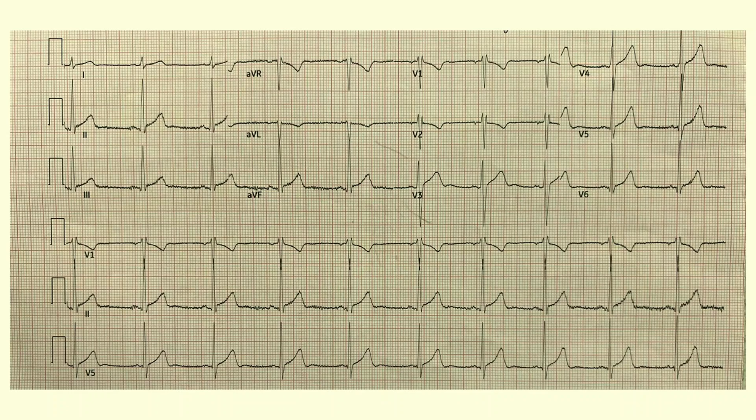But even more importantly, I know for a fact that these electrodes are misplaced because the V1 and V2 P waves are completely upside down. Remember, V1 and V2 are meant to be over the atria. If they're upside down, that means you're way up here looking down on the heart, and all the electricity, the depolarization of the atrium, is going away from you. What you should see is that V1 is over the right atrium. The right atrium depolarizes positive. The left atrium in the back of the heart depolarizes negative. You should see a biphasic P wave in V1, and by V2 it should be fully upright.